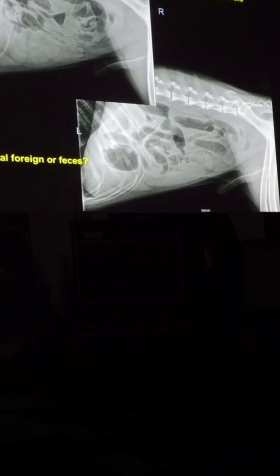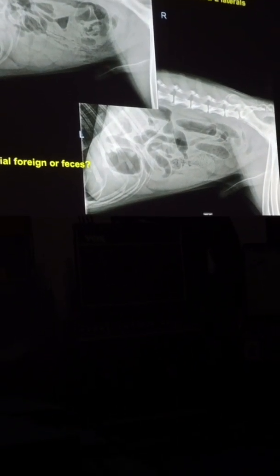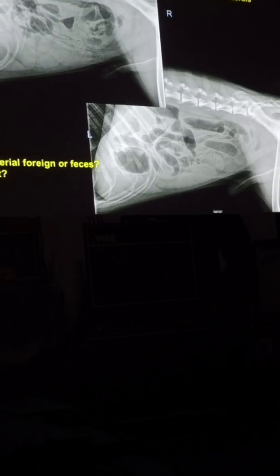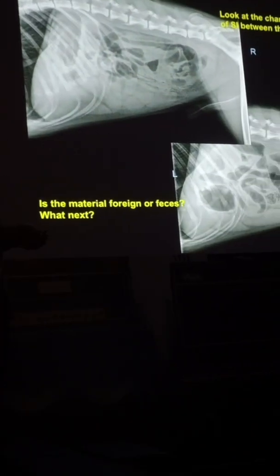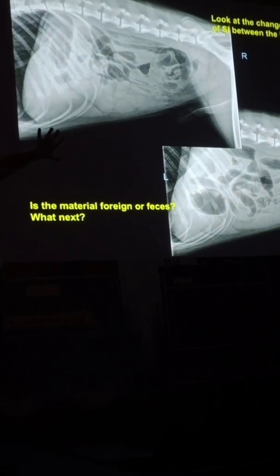So we have an obstructive pattern. We have a mechanical ileus because we've got segmental dilation, non-uniform dilation. Some of that is normal and some is pathologic, greater than 2 times L5. Do I want to go to surgery with this patient?